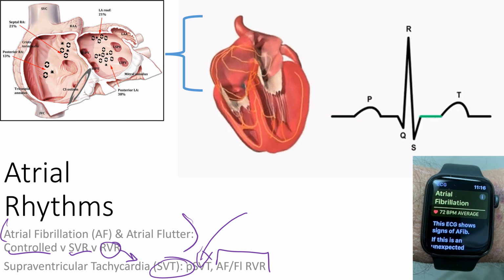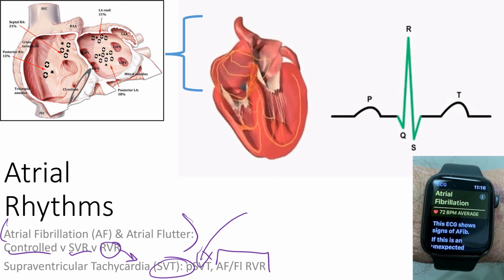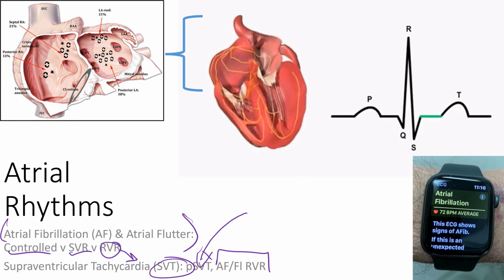There are other ones out there, and you're not being tested on those. So please don't learn AV nodal reentrant tachycardias, or Wolff-Parkinson-White, or multifocal atrial tachycardias. Those are not ones we're going to be learning. There's enough rhythms for you to understand.